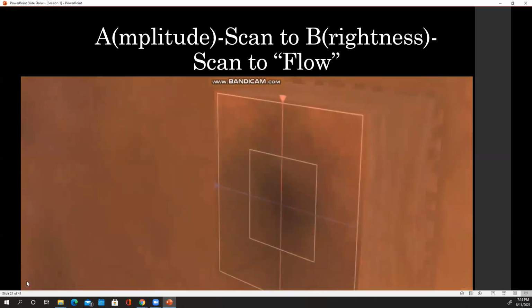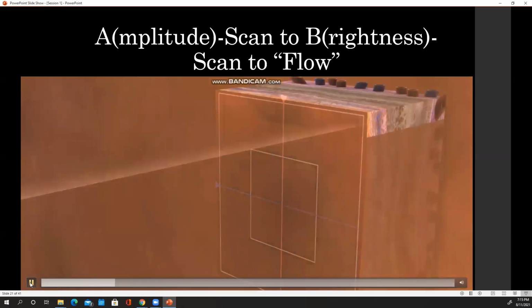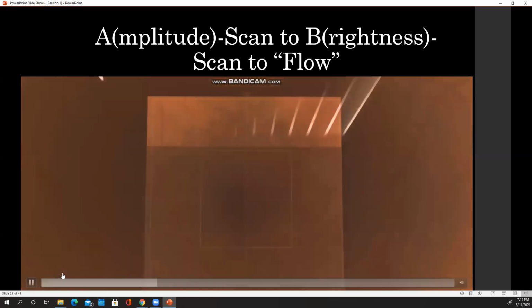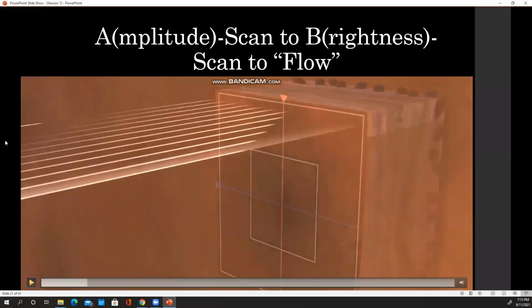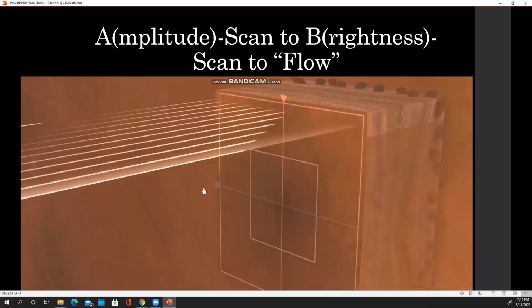So here we go, and I'm going to show you. You see there, okay, and there, and I'm going to move back real quick. So first, imagine each one of these lines is an A scan. And then imagine as I do one of these, one entire slice here would be a B scan, and imagine there are 216 of these A scan points, amplitude scans, and I make one slice right here. This is one B scan, just like we talked about, except in this case, it's light doing it.